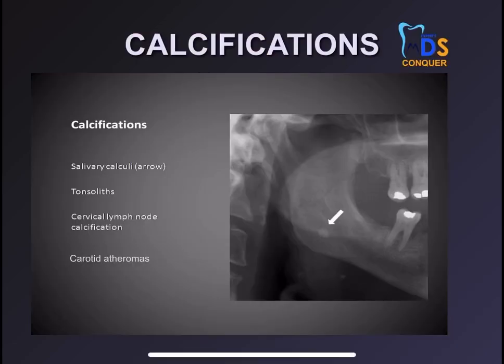Okay, so now we have discussed what the anatomical landmarks are, what the air spaces are, what the soft tissue shadows are, and what double images and ghost images are. So these are actually seen in a normal OPG. Right. Now if we have understood this normal OPG image, then it's easy for us to interpret if there is any abnormality, right?